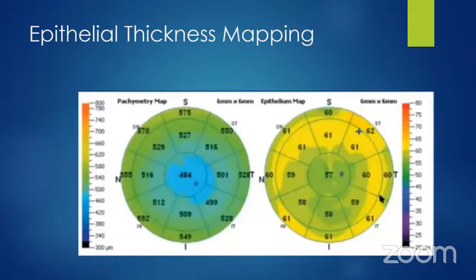So when you just look at the front, you think the curvature is normal. But if you take an epithelial thickness map and separate out the epithelium, the area of thicker epithelium may be where the cornea is actually thinning out. So nowadays we have subtraction tomographies, and the Sirius is one of the methods, which takes the epithelial mapping and subtracts it from the original one. And so you have a tomography from the Bowman's layer level.